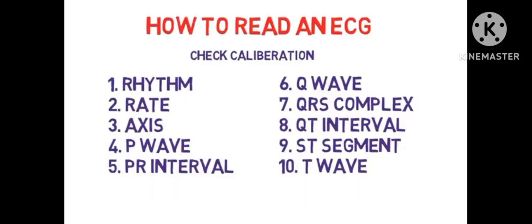So this is all about ECG. Always think of these 10 steps in this manner.